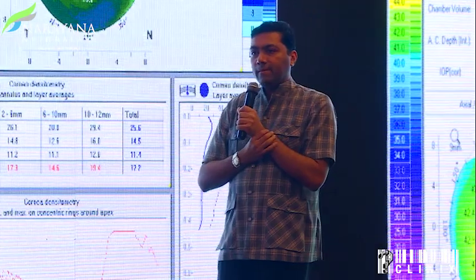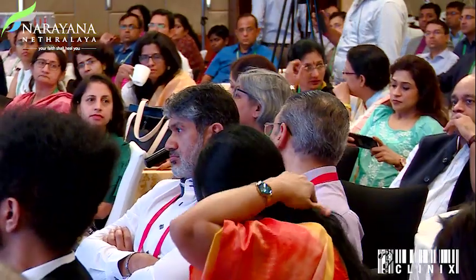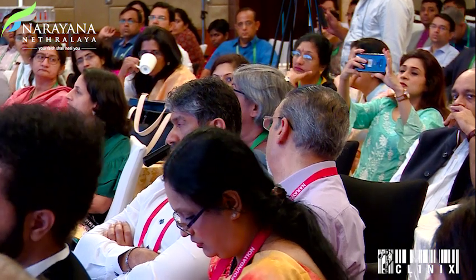Yes, please. Since we don't have ABCD, can Dr. Bellin tell us a bit more about the BAD display and the other features that we see on the BAD display in cases of keratoconus which are very early or suspect, and in case of progression? Because we don't have ABCD.